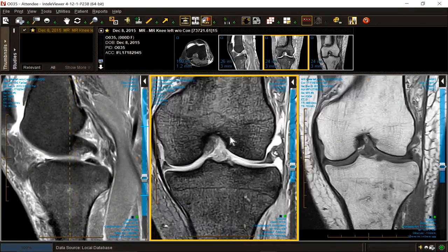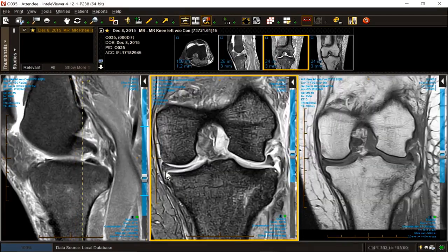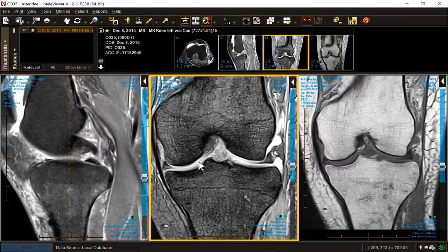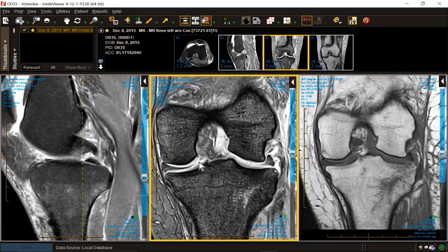Some gradient echoes, especially thin ones, will over-describe and over-show meniscal signal or make it so conspicuous that you will read a tear in virtually every case. This is one of them. But the beauty of it is it also allows you to in very detailed fashion, assess the shape of a symptomatic meniscus tear.